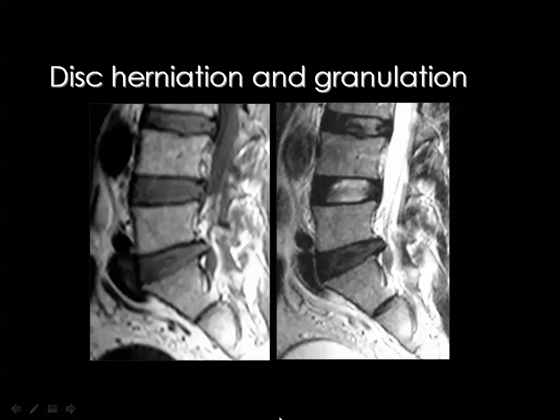Of course, this diagnosis is very important, so that you may say to the surgeon, don't operate. This is not a massive disc herniation. This is just a small disc herniation and is surrounded by granulation tissue, which will regress if the patient is adequately managed conservatively.